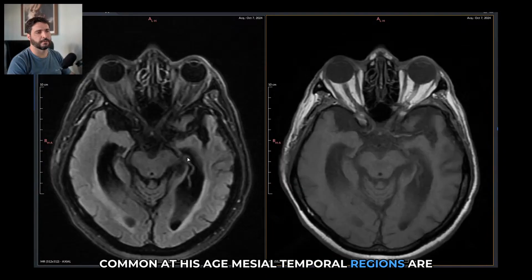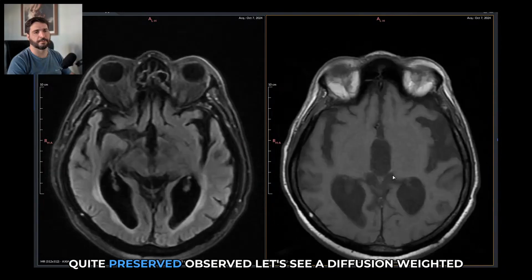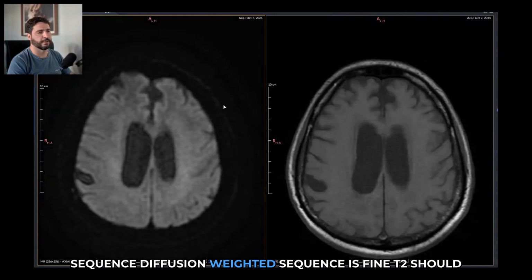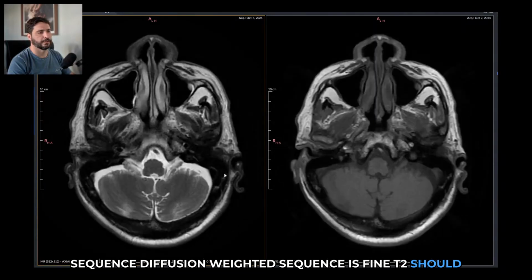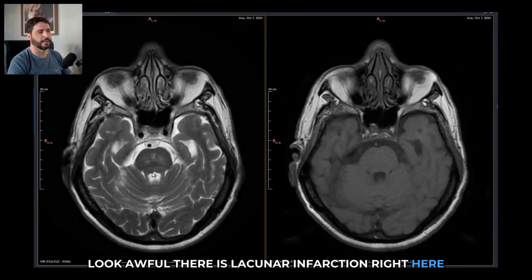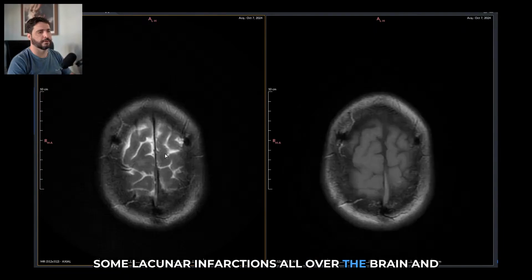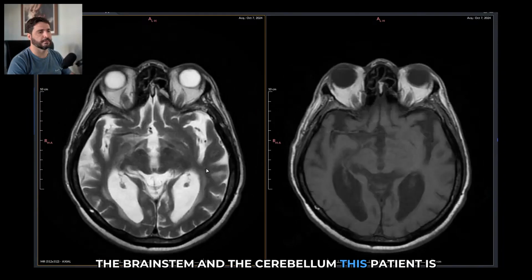Mesial temporal regions are quite preserved. Let's see a diffusion weighted sequence. Diffusion weighted sequence is fine. T2 should look awful. There is lacunar infarction right here. Some lacunar infarctions all over the brain and the brainstem and the cerebellum.